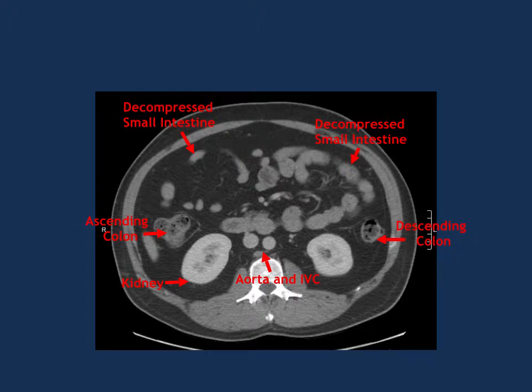Yeah, I agree. And you sort of have to remember, you wouldn't expect that small decompressed intestine on the right. You wouldn't expect a big blood vessel over there. So that kind of helps lead you to think about what that could be. Big blood vessels are more central, whereas the ones out there. And then now we have an interesting, a contrasting one right there.